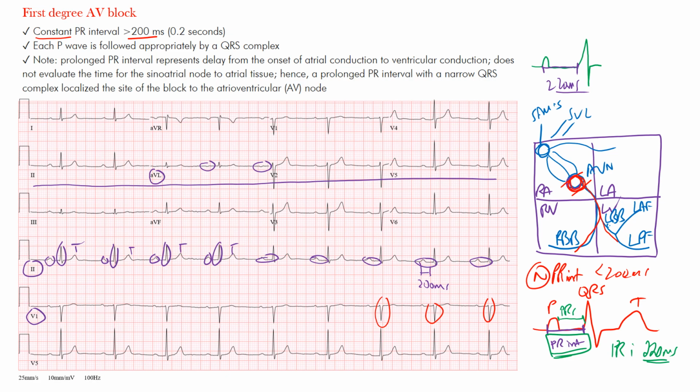Well, this often does not cause hemodynamic instability, and there's no specific treatment required for this, okay? No need for a pacemaker, as we'll see with different types of blocks where we would actually require one, but in this case it's quite well tolerated. You always have a P wave followed by a QRS complex, so there's always an atrial contraction and ventricular contraction, and no issues there.